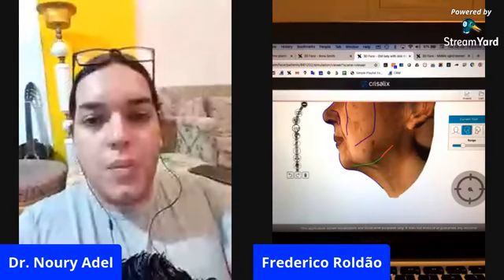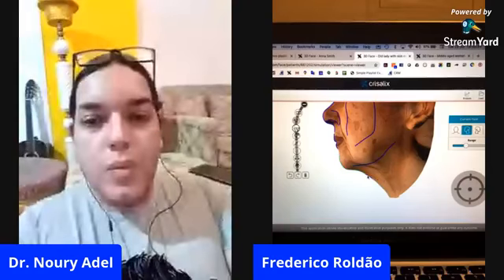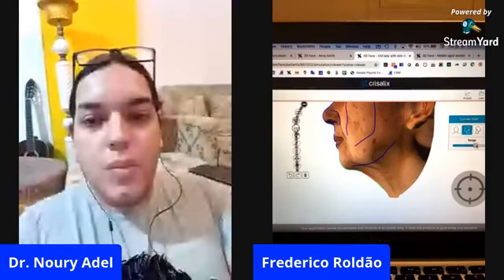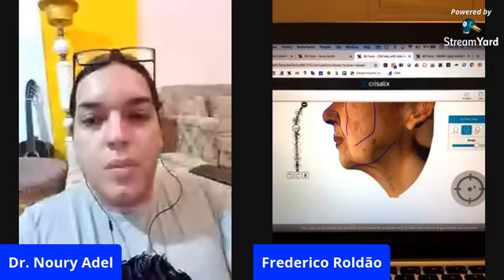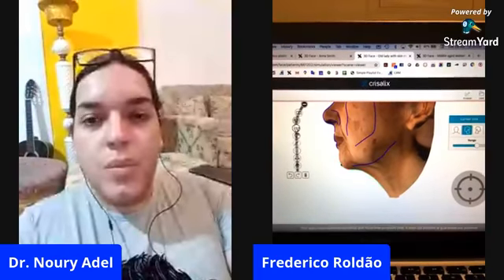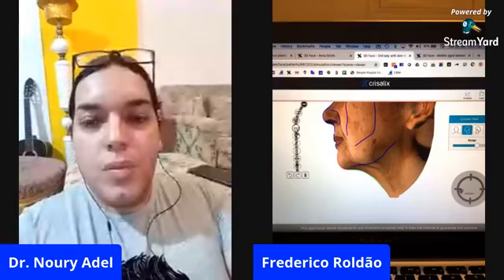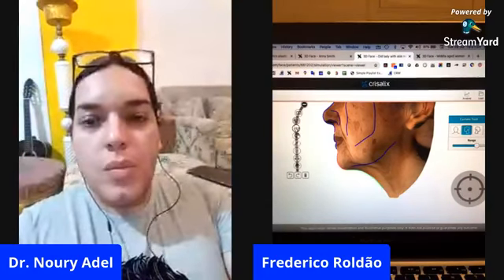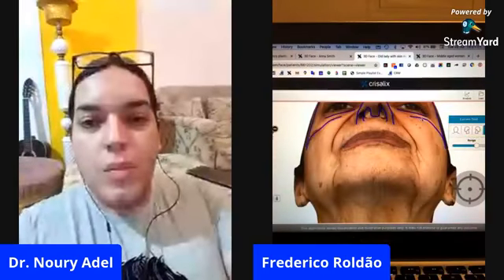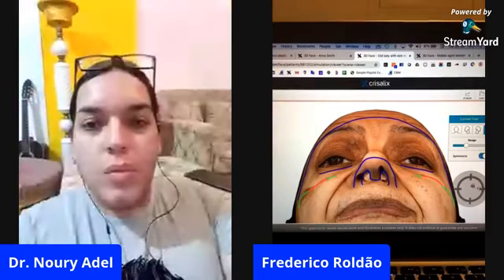I will raise the jawline here a bit as well, and I will take a bit of ptosis away from the neck. Okay, and maybe why not enhance the chin a bit? I think she could take advantage of that. Okay, let's take a look at her from below and maybe work a bit on the volume here as well.